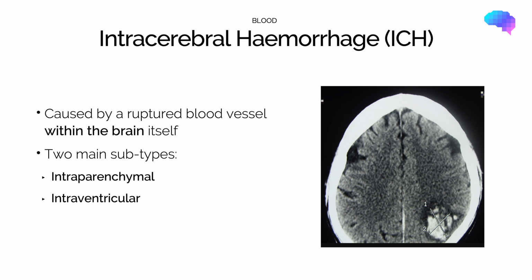So this slide demonstrates an intracerebral hemorrhage, which again has a very different shape to some of the other bleeds that we've looked at. So from first appearances, we can see that it doesn't really fit the description of an extradural or a subdural hematoma. It doesn't stick to the periphery. It doesn't have this well-defined, concave or convex edge. But at the same time, it doesn't follow the subarachnoid spaces and doesn't have this characteristic star-shaped appearance that we would expect from a subarachnoid hemorrhage.